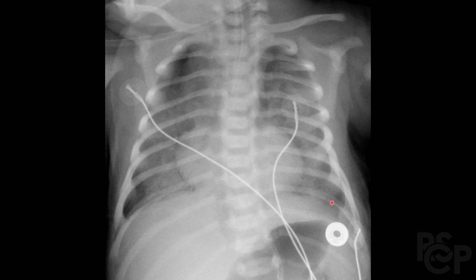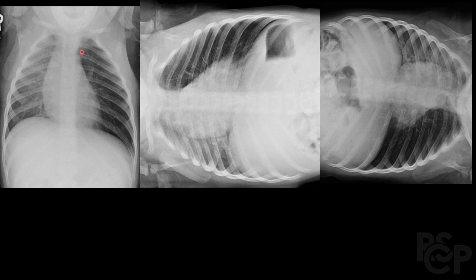No signs of pleural effusion anywhere. Costophrenic angles are visible clearly. So this is an example of a pneumonia. And again, pneumonia can have very variable presentation. Okay, so this might be a little different than the previous pathologies that we discussed, but I thought it fit well in this video because this is a very high yield concept that tends to be tested regularly.